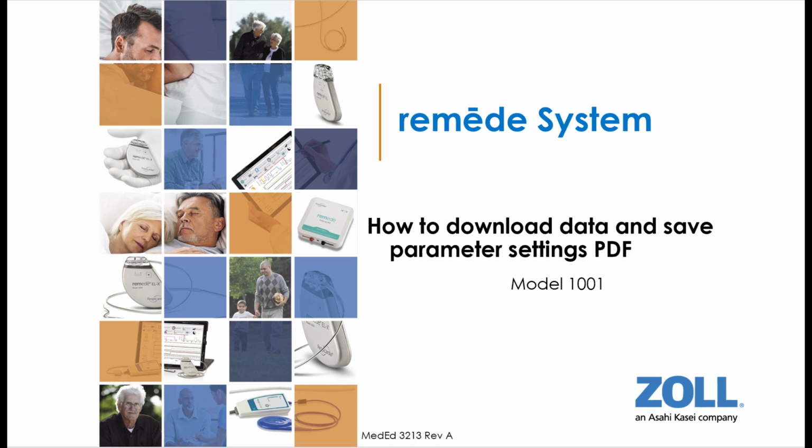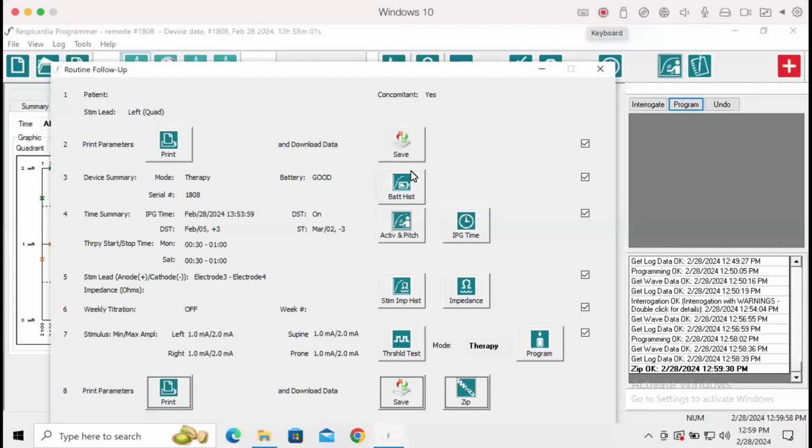How to download Remedy device data and save pre and post parameter settings PDF files on Remedy Model 1001. How to download Remedy device data and save pre and post parameter settings on Remedy Model 1001.